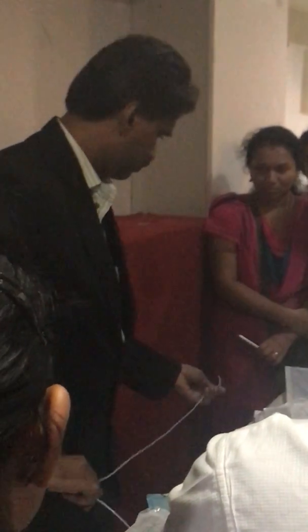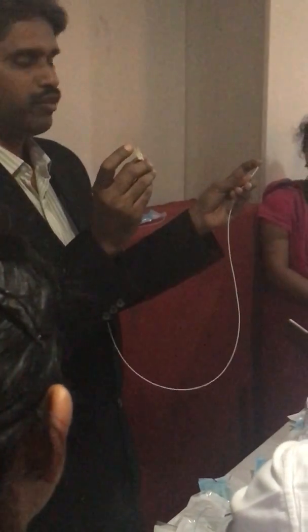Suppose I show you the ordinary catheter. If you want to inject through this, you have to remove the guide wire inside. If the guide wire is inside, you can't inject. Here you can inject by attaching this, so the guide wire will come through the straighter arm, and through the side arm you can inject contrast. That is the main use of this.